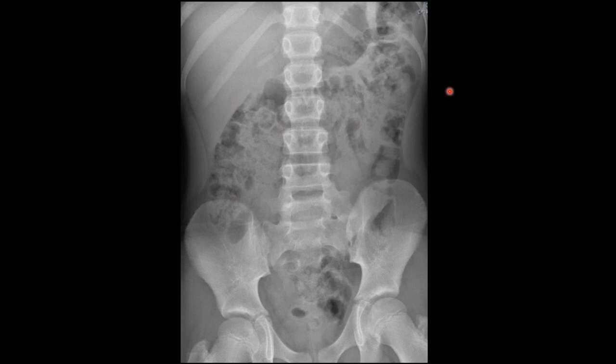So again, if you were suspecting constipation, then you'd need to do a transit study. The normal diameter of the large bowel is up to 5 centimeters. If it's over 5 centimeters in diameter, then it's considered dilated. The small bowel is up to 3 centimeters, and you shouldn't see more than 2 distended loops. If you see 3 dilated small bowel loops or more, then it implies a small bowel obstruction or possible ileus.